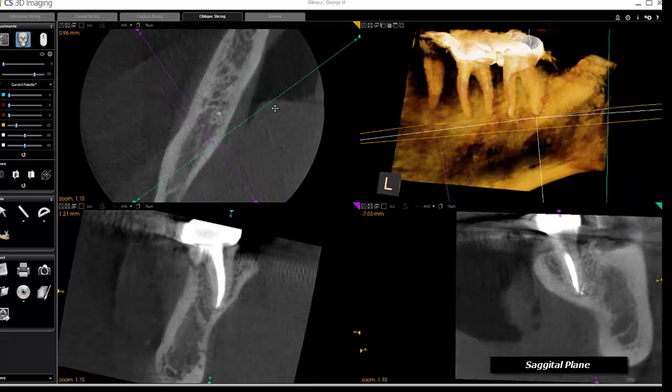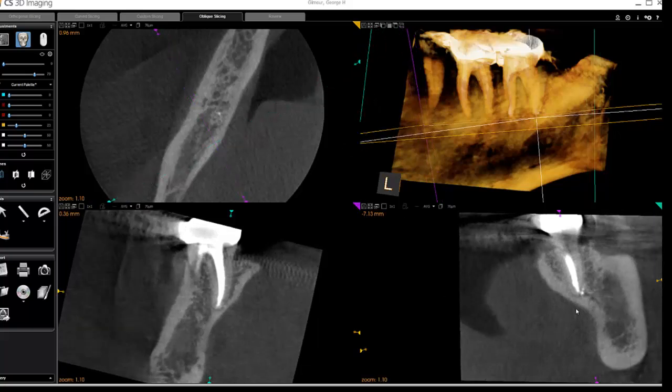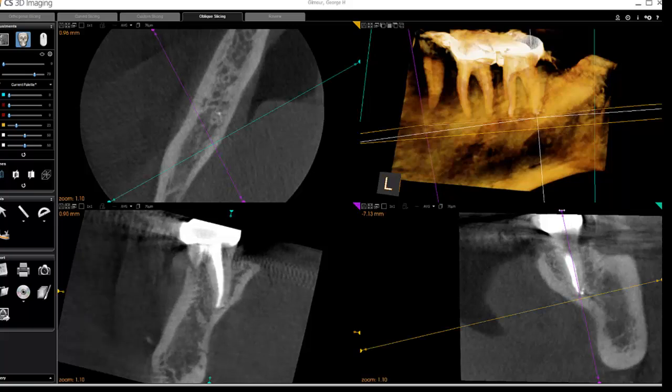That one also looks pretty normal. Now, from this view, you can see the little sealer puff on the right lower panel. Yeah, it looks like maybe there's a little radiolucency around that. That could be foreign body reaction, but I like to note that. Any area where bone hasn't grown back completely, I like to note.